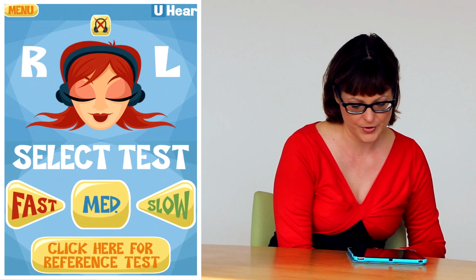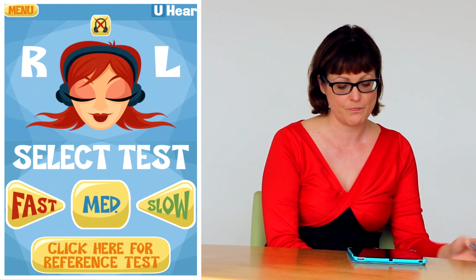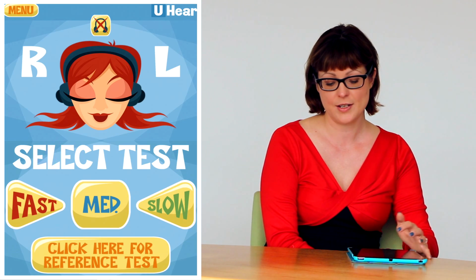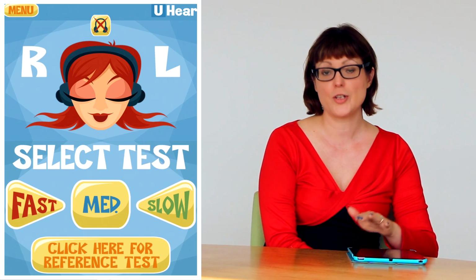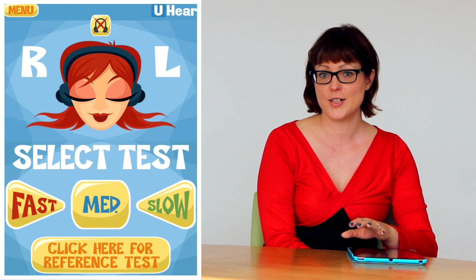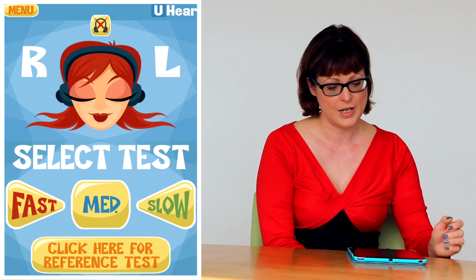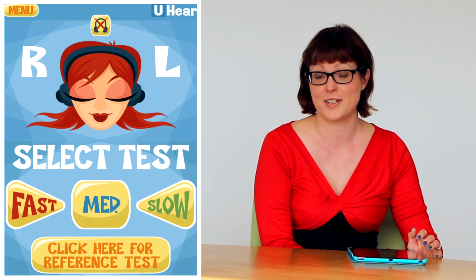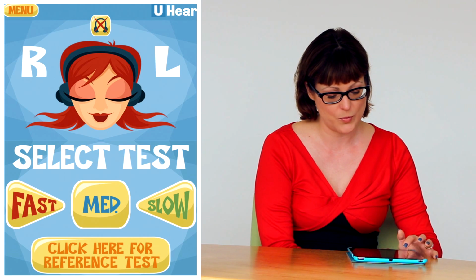And you have an option to select a different speed test. So we have a fast test, it still takes a couple of minutes, medium and slow. We do suggest you consider doing the slow test, as you will get better results from that. So I'm going to actually quickly run through the fast test today because we haven't got time to do the slow one. So you just tap on the option for you.